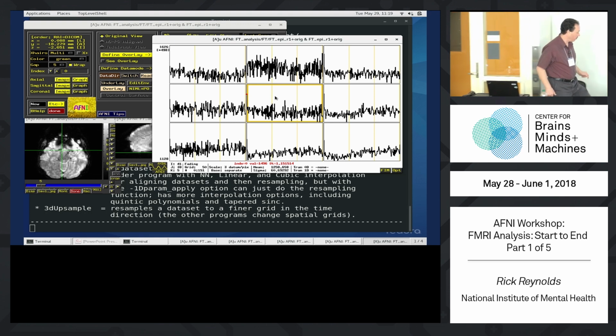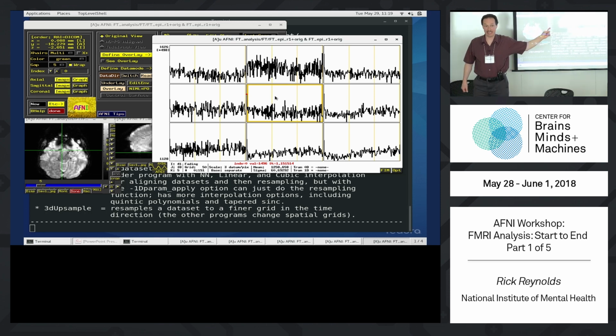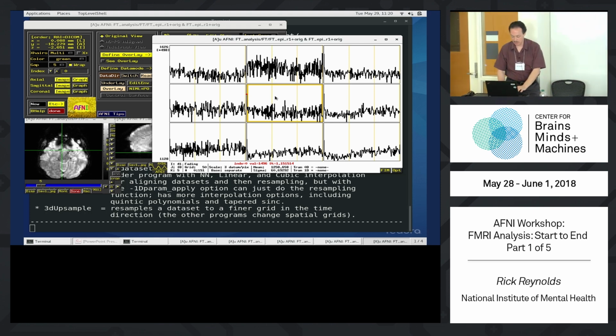You can see the red dot, the current data point, is way up high again. That's an indicator that you've got your pre-steady state data in here. So you'll want to remove time points. If you don't see that here and you are removing time points, you better make sure of what you're doing, or vice versa. Okay, so the data looks good.